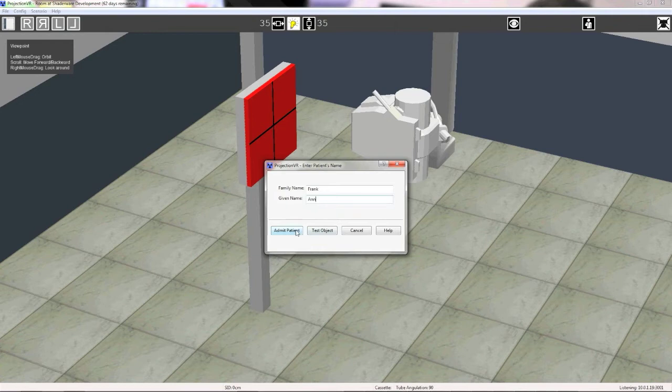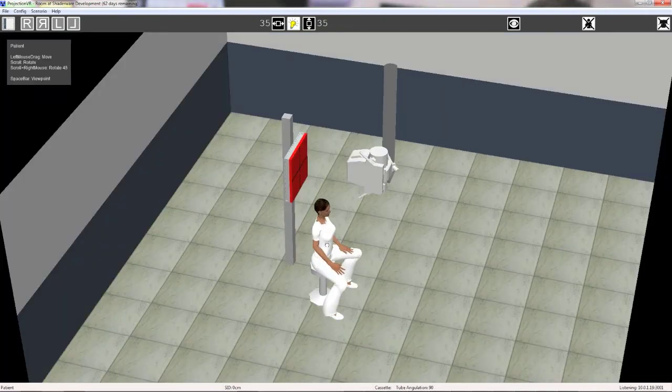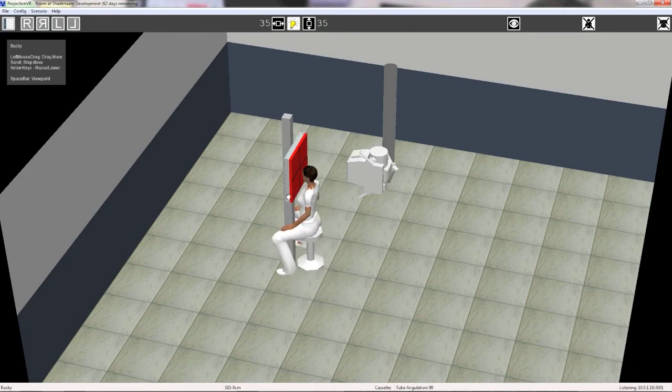Various changes have been put in place to address these issues, such as keeping student numbers down, pairing new students with final year students, and equipping students with some basic skills before they enter the placement. It is this last strategy that one of the elements of virtual radiography can help with. Projection VR provides a fully featured radiography room complete with table, tube, receptors, side markers and collimation controls, all within a computer on a desk.